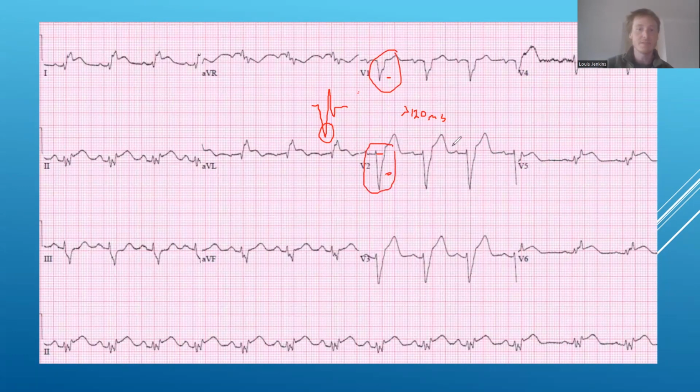And then there are some other diagnostic criteria for left bundle branch, where we look for prolonged R wave peak time and R wave notching and those sorts of things. But to be honest, I usually have to look those up if I'm trying to get really technical with it. But if I see these things together, and the ECG has this type of morphology, it tips me off that this is likely to be a left bundle.